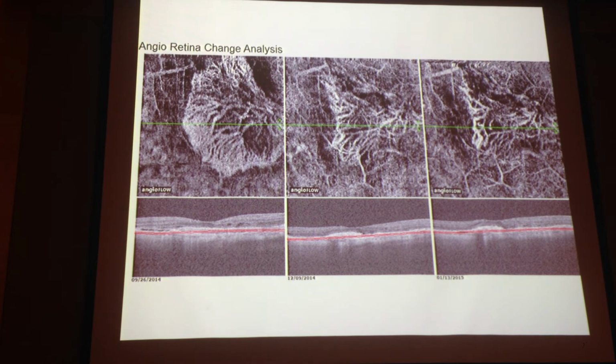But there is a new treatment. It's called Fovista. It's anti-PDGF. And the idea of the anti-PDGF is that since it's acting on the endothelial cells, the lesion should decrease in size and disappear in some way. So this is a patient that was treated, and you see that, of course, this is the best visualization using the right slab.